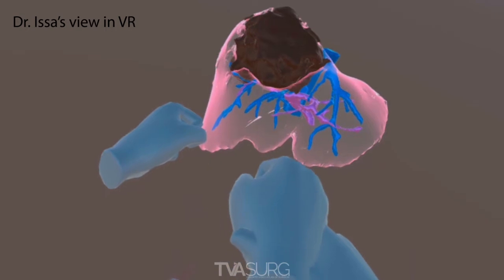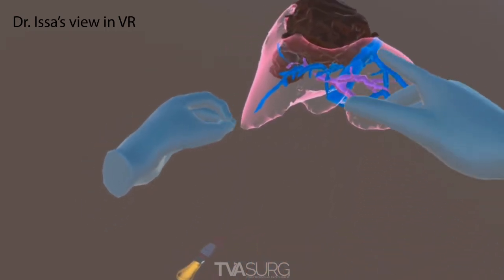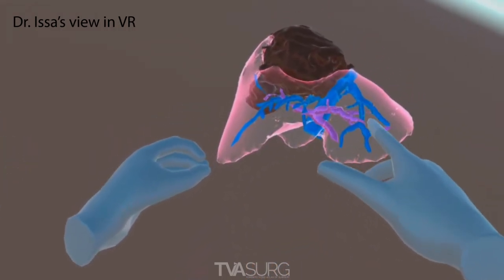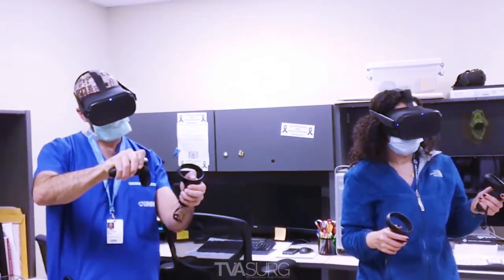Yeah. Okay, do you think the portal vein here is going to be okay? Yeah, I can see there's a good margin. What I would worry about is the left portal vein, and there will be good margin away from the tumor. Exactly.